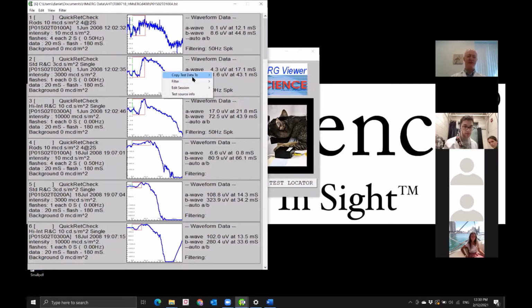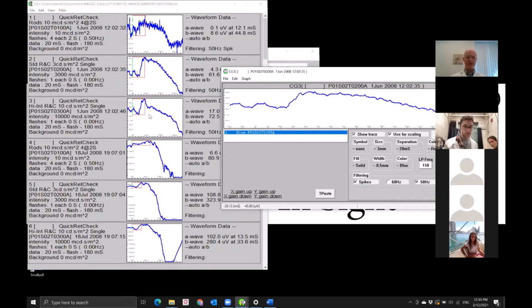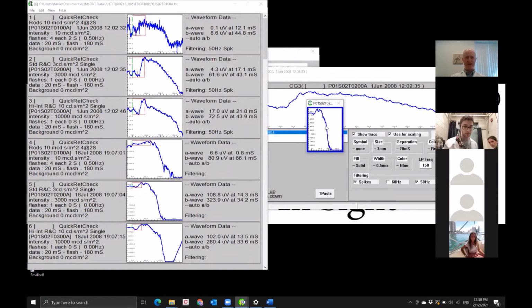So let's go through that. Put a comparison graph together and drag it over here. So that's the A channel. Let's do A channel to A channel and just see how that might turn out.